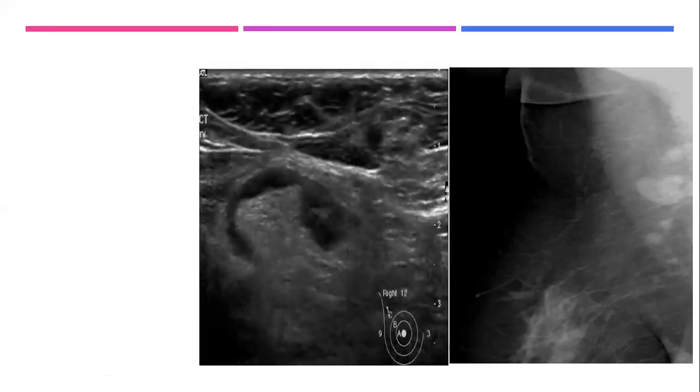Yes. Ultrasound. The fatty hilum is there, but it's big and irregular, and there is bulkiness at one side of the lymph node. You have heterogeneous focal cortical asymmetry. Yes, and heterogeneous, it's not at the same density. Excellent. So yes, ultrasound definitely solves the problem.